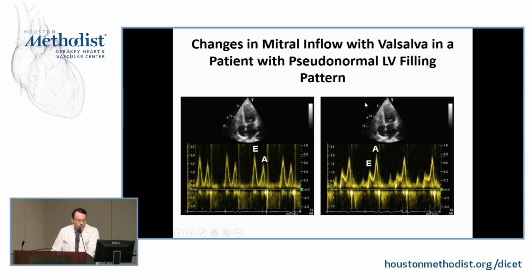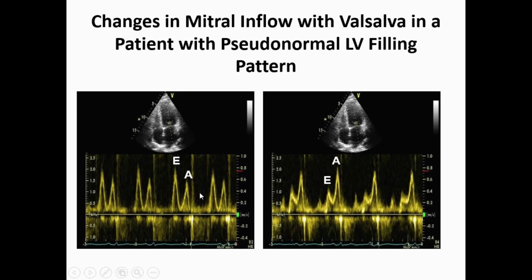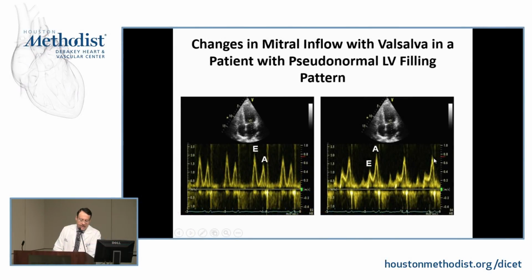Next is the mitral inflow, looking at what happens to it with Valsalva. During the straining phase, venous return drops, left atrial pressure drops, the transmitral pressure gradient falls, and you end up with a low E, high A. So why did it change? Because the LAP is up, and that got unmasked by Valsalva. The challenge with the Valsalva is getting a patient who is cooperative enough and the ability to standardize the effort. As a result, its sensitivity may not be that high, but its specificity, if properly executed, is pretty good.